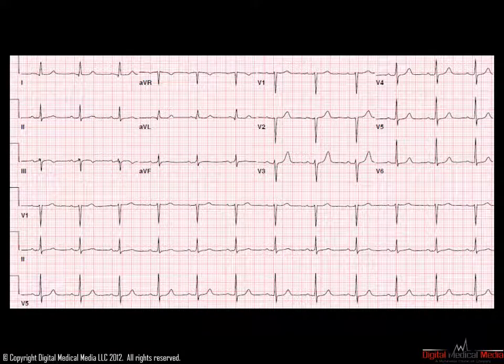In this tracing, lead 1 is overtly positive. Remember that it is not only the height of the QRS signal, but its width as well. It is a question of the volume under the curve. Compare lead 1, which is mostly positive, to lead AVF, which is also mostly positive, but with a slight S wave at the tail end of the QRS. If we look at the total volume in lead AVF, it is still positive.